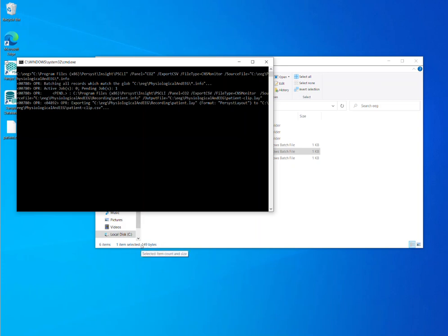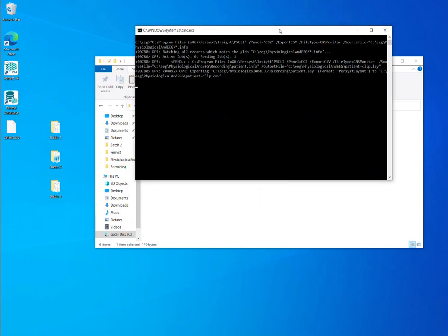So that's just a few tips and tricks of working with the Moberg physiological data to get the CSV values from the trends with the elapsed times indicated in one of the columns, with the option of exporting high resolution CSV value for those physiological trends as well. With one twist, you want to have a panel with just that trend in it. You don't have to reprocess the whole thing. You don't have to reprocess it at all. You just run a batch file calling out the panel that has those particular values, and it'll write them out.